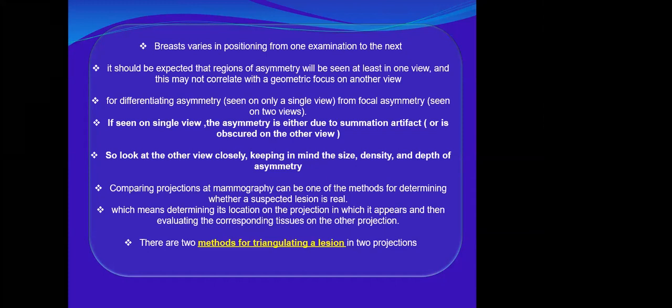According to that, there are two methods for triangulating the lesions, as we described before. What are these two methods? The arc method, excellent, and the straight line method.